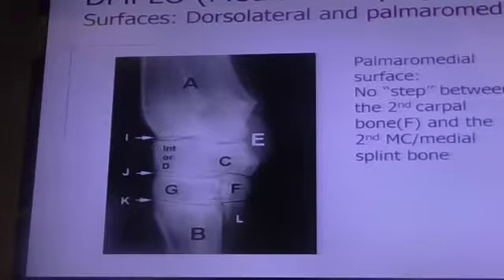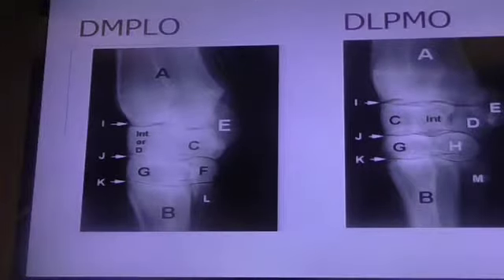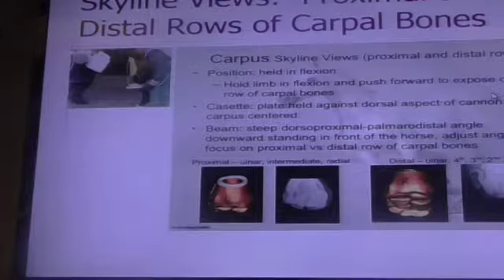Just like digits. Okay, lateral oblique and medial oblique. You can see them now, they're right together. The accessory carpal bone also helps you. It's projected, and that's a lateral structure.